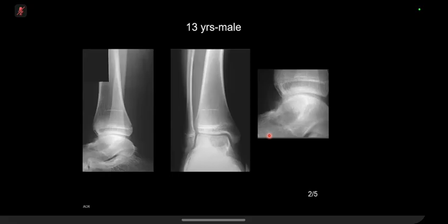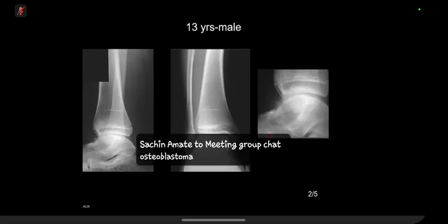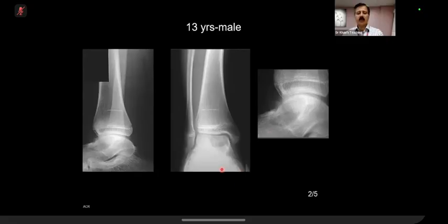In a patient with this age, this is most likely an epiphyseal kind of lesion, a single lucent lesion. So ABC is arising from that pre-existing lytic lesion in the dome of the talus. I'm just struggling to find out what this primary lesion could be in the dome of the talus, and then from there ABC is arising. Okay, that's fine. I'll take over. It's because of benign appearance, because of narrow zone of transition.